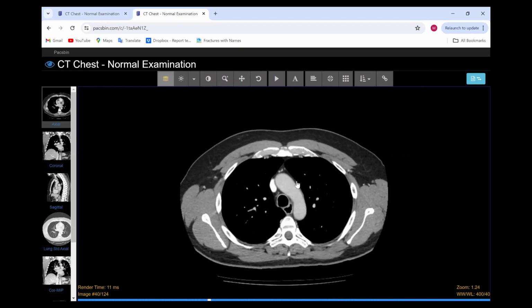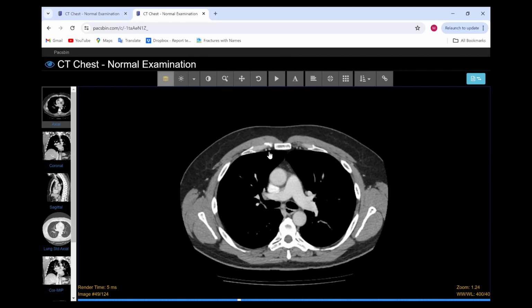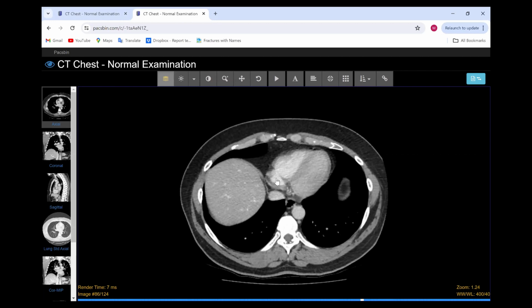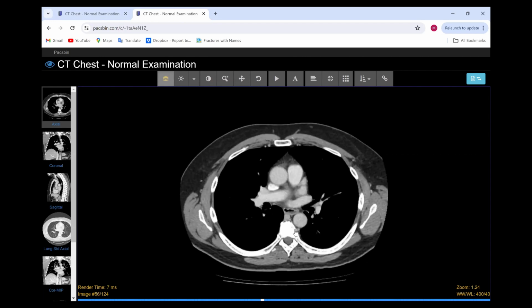So we have the mediastinum here, with multiple stations in the mediastinum. Also, we have axillary lymph nodes. We have intramammary lymph nodes as well, and we have subdiaphragmatic ones here. Sometimes we have lymph nodes. Also, we have retrocrural, or behind the aorta, as well.